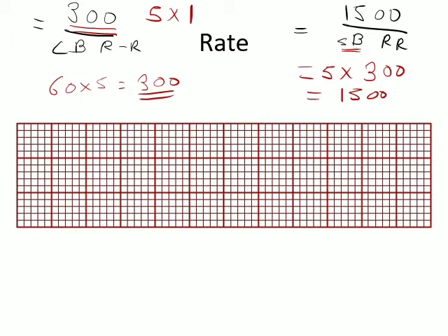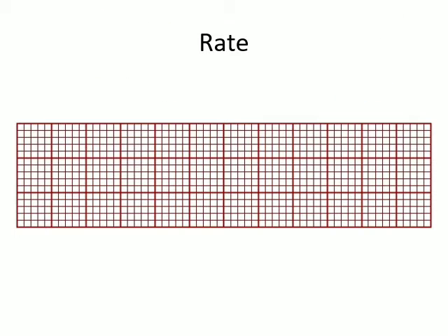I want you to write down these two formulas, and I'm going to erase what is written on the screen. I'll take a 1 second pause for you. Now what I'm going to do is again draw two successive beats of ECG.